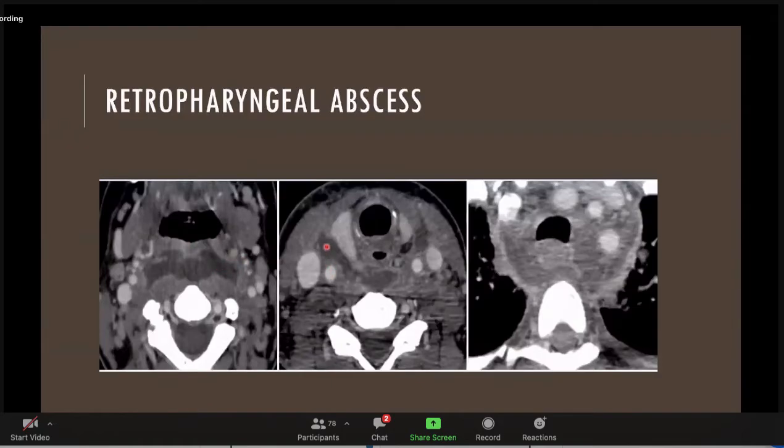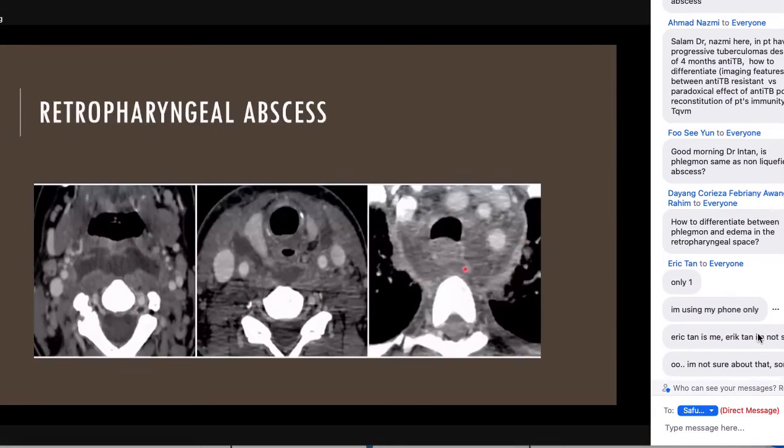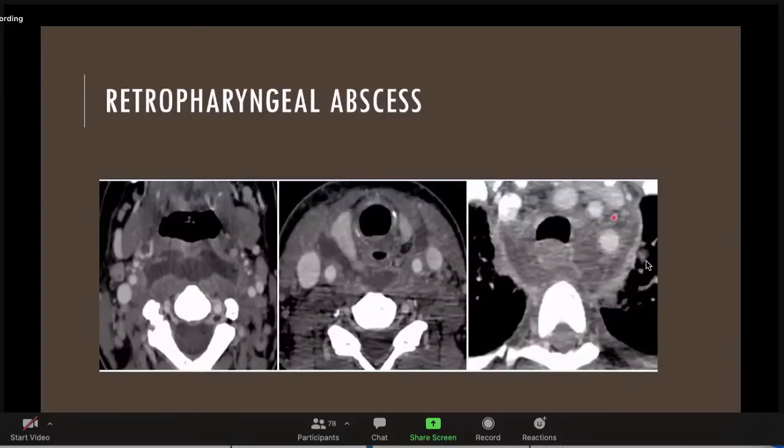We can see in these images that this abscess spreads inferiorly all the way to the superior mediastinum around the trachea, the esophagus, as well as the great vessels. Management in this case needs to be more aggressive as it will unlikely respond to just supportive care and antibiotics. Surgeons will consider putting a drainage catheter to drain the pus.